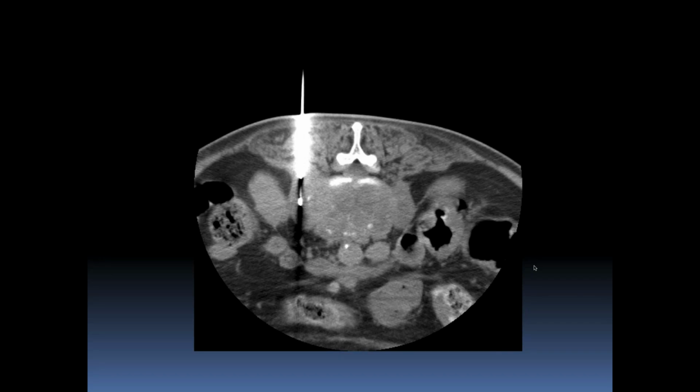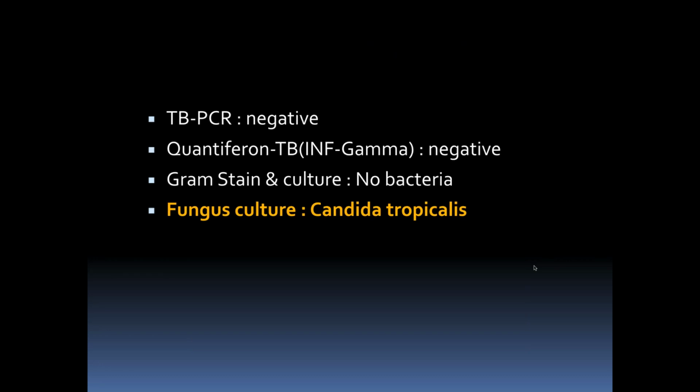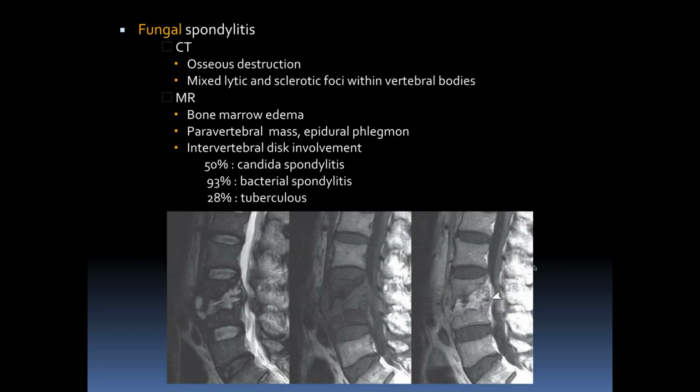They're trying to do some, probably fluid collection. Yeah, try to get an organism. Right. So they're concerned about fungal, tuberculosis, pyogenic. And this turned out to be Candida. Okay.